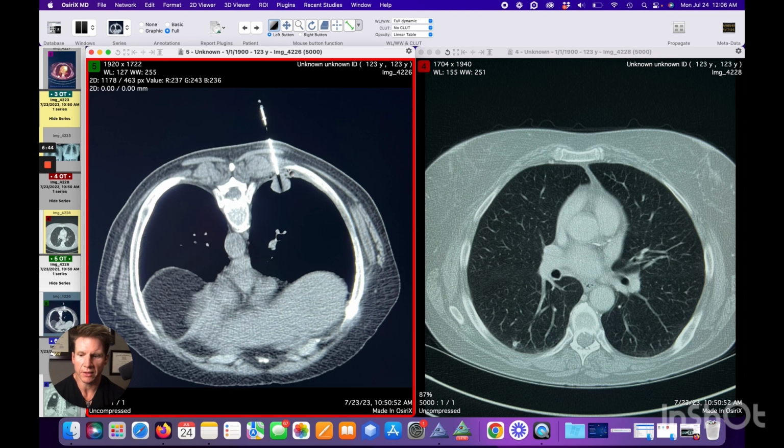the chest x-ray. So, don't be concerned if you didn't see that one. You want to obviously take time and get good at looking at these chest x-rays. If you have not already developed an approach to looking at chest x-rays, I can send you a link for my approach with a free tutorial on my approach to evaluating a chest x-ray.